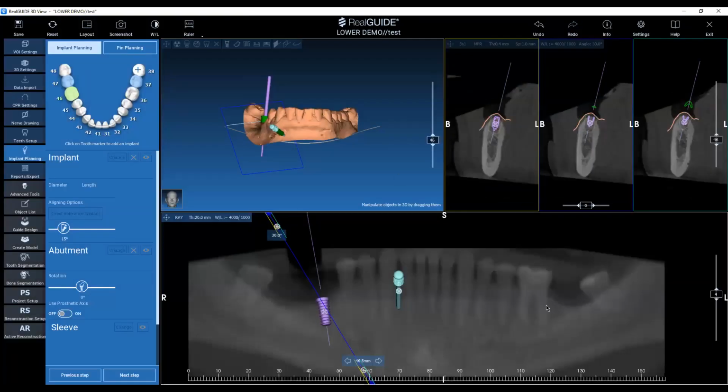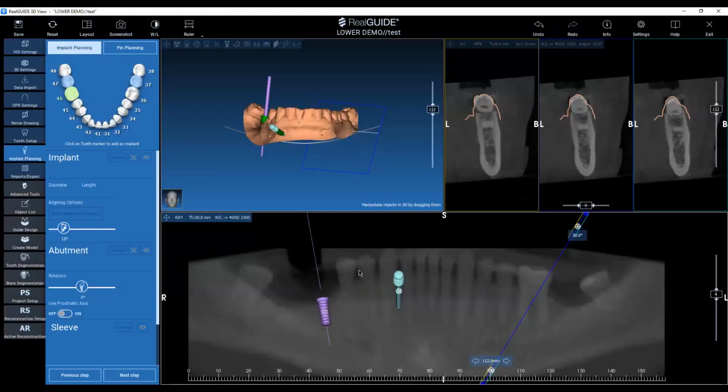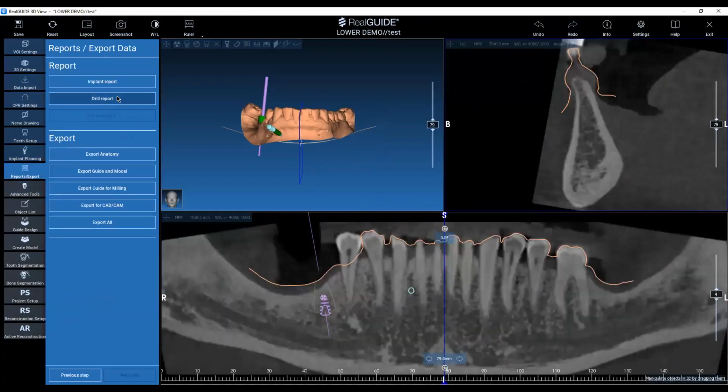Okay. Okay. Report. We'll see it. They can't see it now, right? Yeah, we continue to see the software.